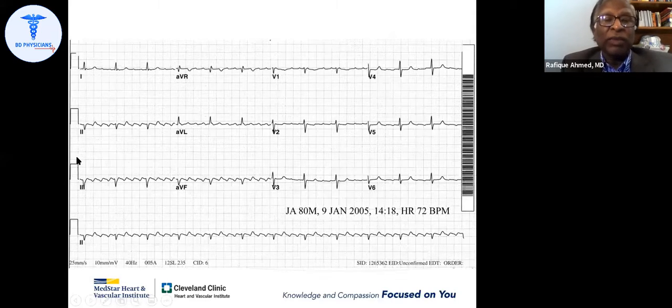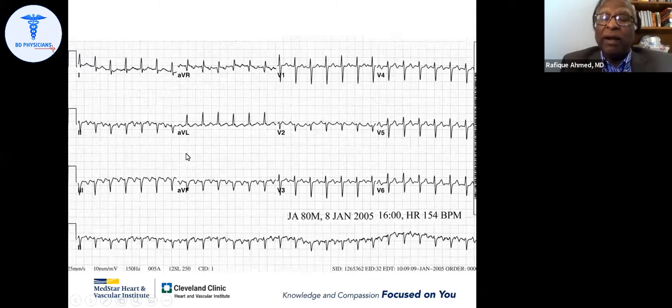The same patient, look at this one, the rate slows down. Now you can see the sawtooth, right? Yes, sir. So look at lead V2 that we saw before. See these positive waves? Diagnosis of arrhythmia always requires a little bit of imagination. I could have been happy with this diagnosis, P wave before each QRS, sinus tachycardia, but then I thought this is a little too fast for sinus tachycardia. And I started thinking, is there another P wave? I said, well, maybe this is another P wave. And that's how we go by.